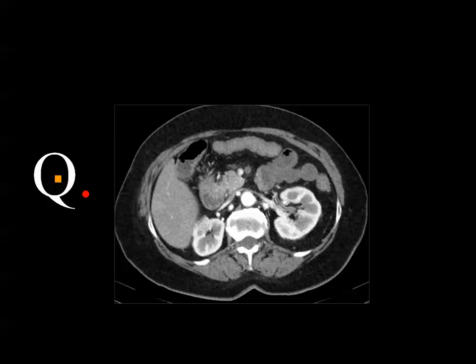And also the relation between the superior mesenteric artery and vein is reversed. This should be the site of the artery, and this should be the site of the vein. But here you see the vein is occluded and the artery is patent compared to the aorta. And you may see some fluid levels within the intestine. If the superior mesenteric vein is thrombosed, it will lead to ischemia, and ischemia will lead to ileus, and ileus will show multiple fluid levels. And also the rotation in itself can cause some obstructive symptoms. This is the head of the pancreas, and this is the duodenal loop, this area.